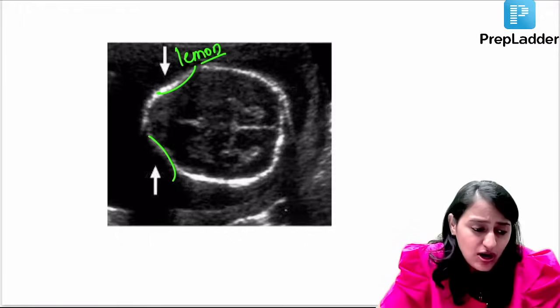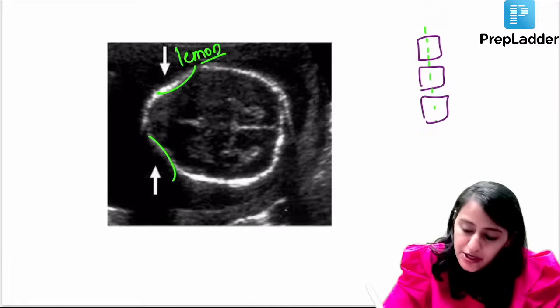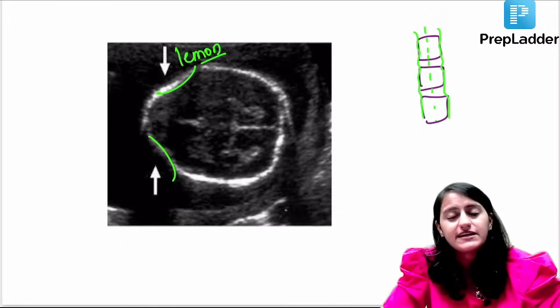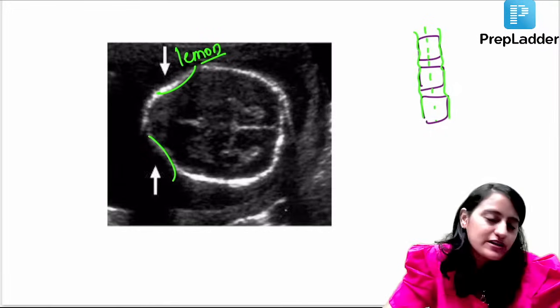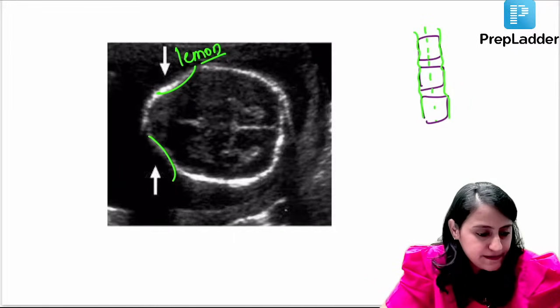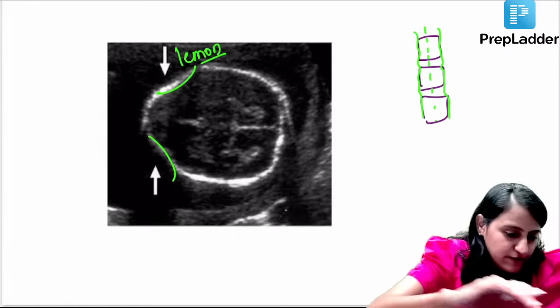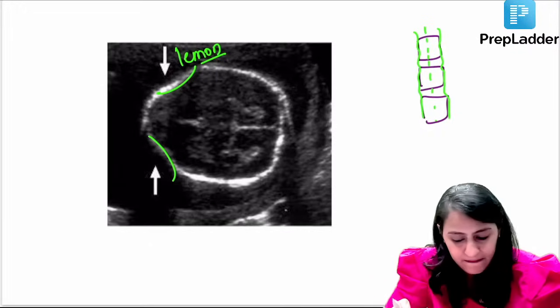Rail track and trolley track sign. So in ankylosing spondylitis, what is happening is your interspinous ligament is getting fused. Your vertebrae are also getting fused by the formation of the syndesmophytes, right? So all these parallel lines which are coming in, that is what gives that railroad or the trolley track appearance. Okay, clear with everyone? Yes.